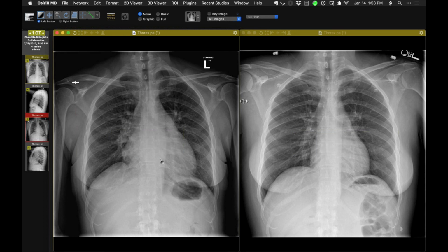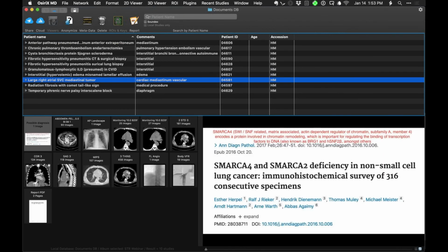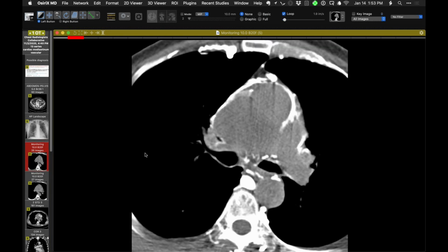Certainly that's really unusual compared to the usual things we look for, like peribronchial fluid cuffs, subpleural edema related to the fissures, and septal lines for interstitial lung edema. And perhaps one misses that because it's really subtle. But I thought I'd show that because I'm pretty confident that's what it is. It's a new finding from before, or a couple of years before, in this person with other findings of mild interstitial edema.